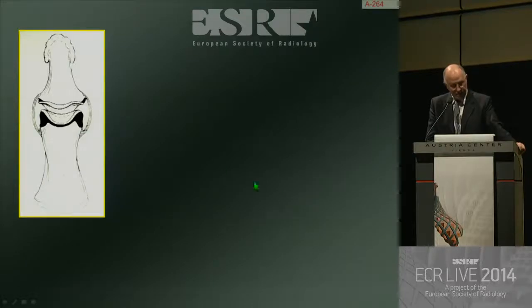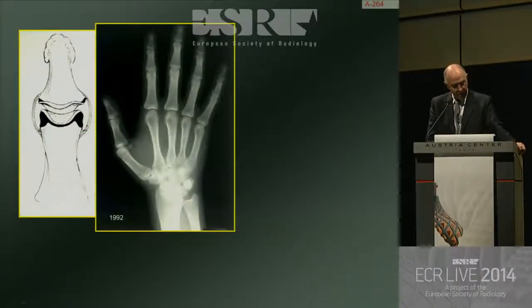More specifically, the reason why you look at it on the proximal part of the joint is because there's a larger bare area in black here than on the distal part of the joint. So the synovium will hypertrophy and cause erosion at the site where there is no articular cartilage cover, which is why we call it a bare area. So have a look at this sequence. Just focus on that radiograph for a moment of that joint.